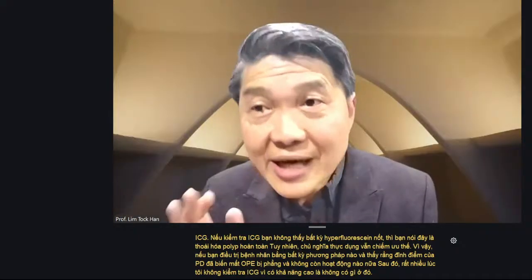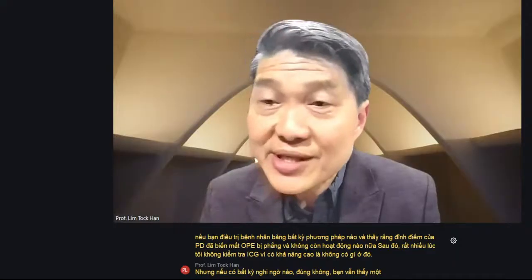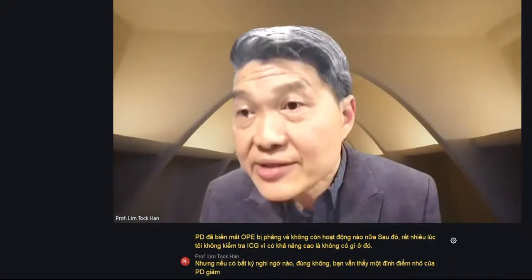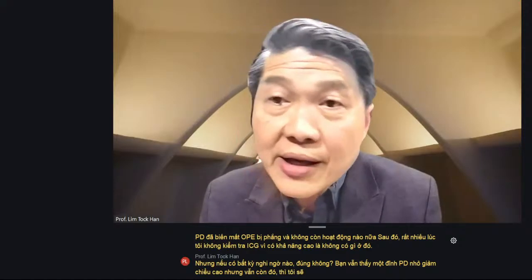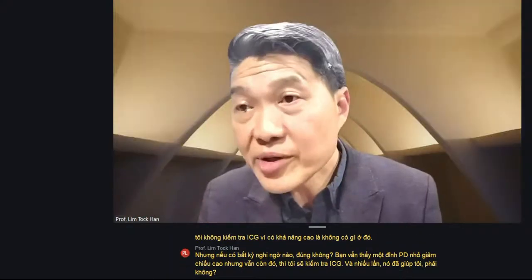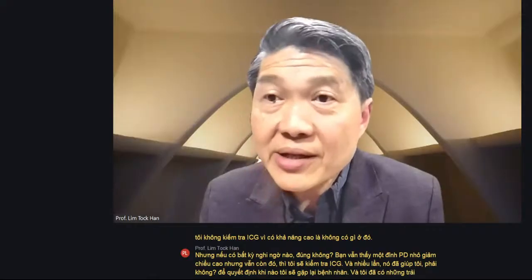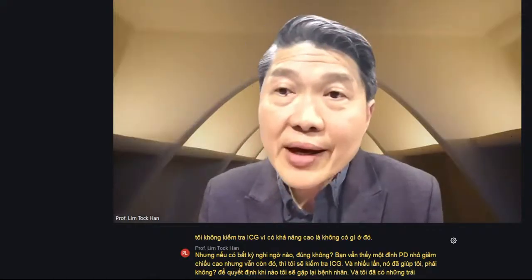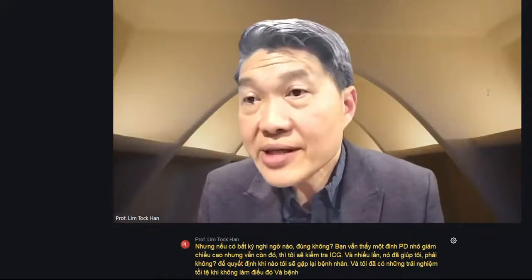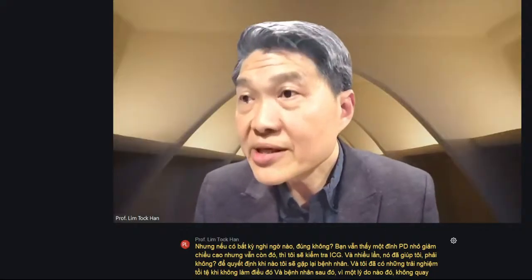But if there's any doubt, you still see a small peak PED that's reduced in height but nevertheless still there, then I would do a check ICG. Time and again, it helped me, and to decide when I'm going to see the patient again. I've had bad experiences when I didn't do that. The patient, for some reason, didn't come back for treatment, and then you see a bad submacular hemorrhage later.